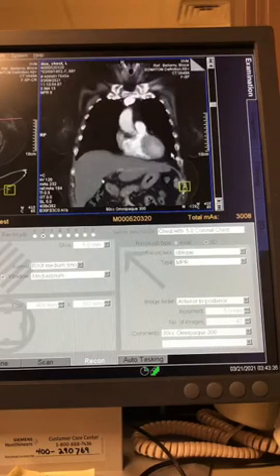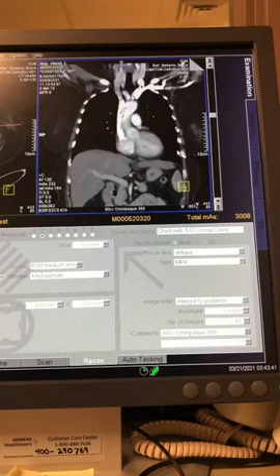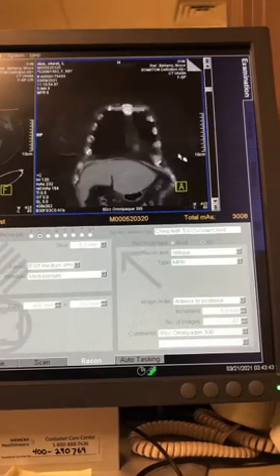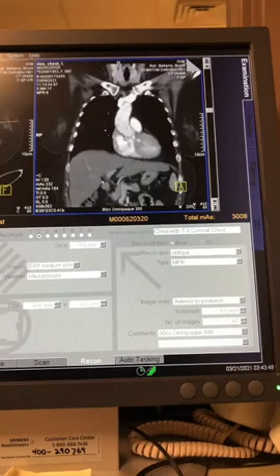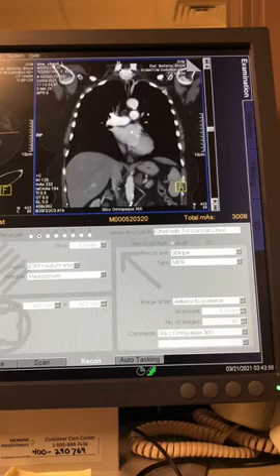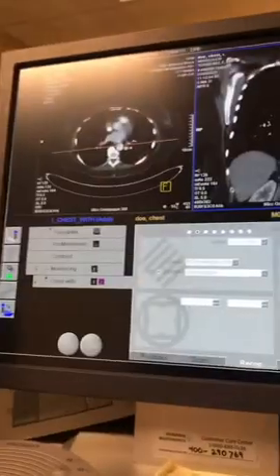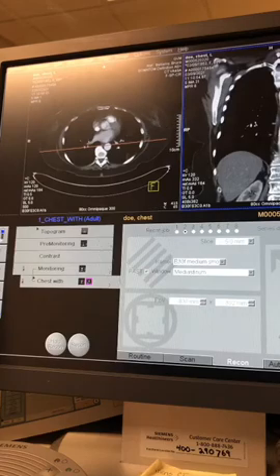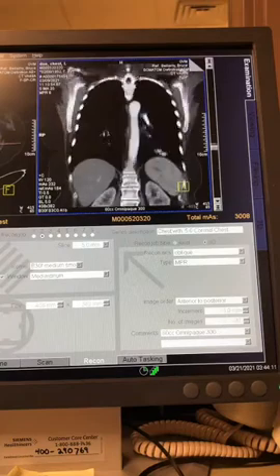And I know it might drive you crazy watching me scroll back and forth, but as you study your anatomy for these things, this is how I would encourage you to study. If you get your hands on a CT, scroll back and forth. Find a structure like here's our ascending aorta, right? We saw it on the axial. You can look over here and it verifies on the axial where I was talking about. Here's our ascending, and then as we scroll posteriorly, like I said, it goes superior, and then it swings down, and there's our descending aorta over here, right?